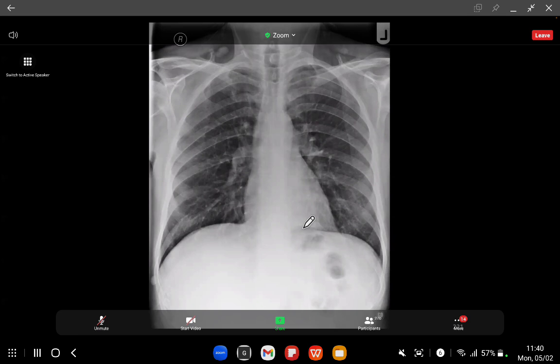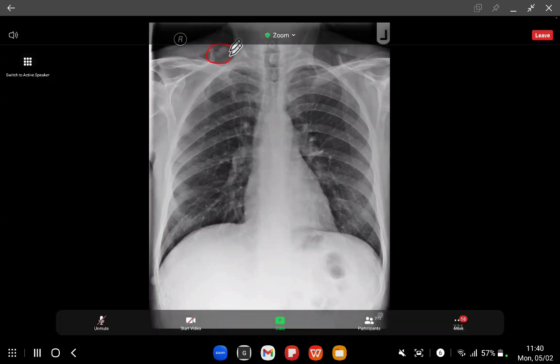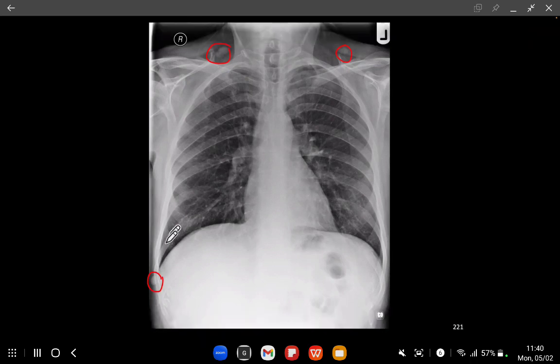Okay, what is wrong with this patient who has got high blood pressure? Bavia Bassetti was instantaneous off the blocks, and we can see here neurofibromas, and there's a neurofibroma just there. Why might this patient with neurofibromatosis have high blood pressure? Well, they could have essential hypertension like everyone else. They could have renal artery stenosis. They could have a pheochromocytoma. They could have coarctation because neurofibromatosis is associated with coarctation.